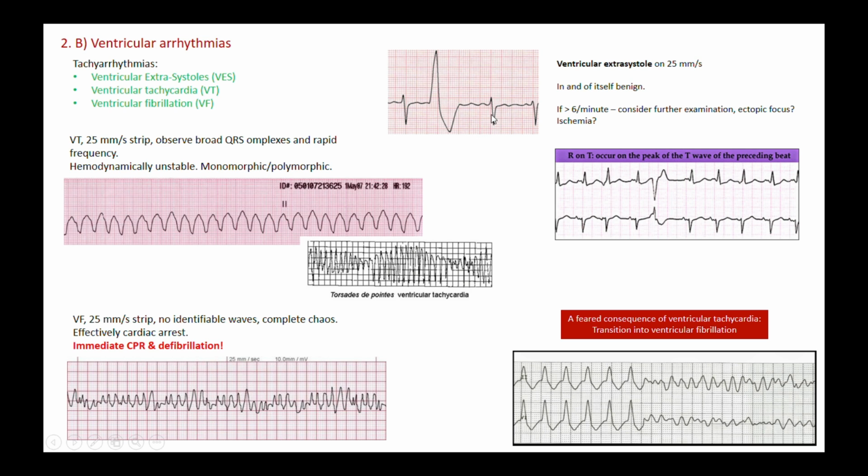So we compare it. Here you see a normal ventricular depolarization happening because of a signal from a higher rhythm center, like say from the AV node, the bundle of His and so forth down. But it happens outside of this and we get a very broad, large QRS complex.